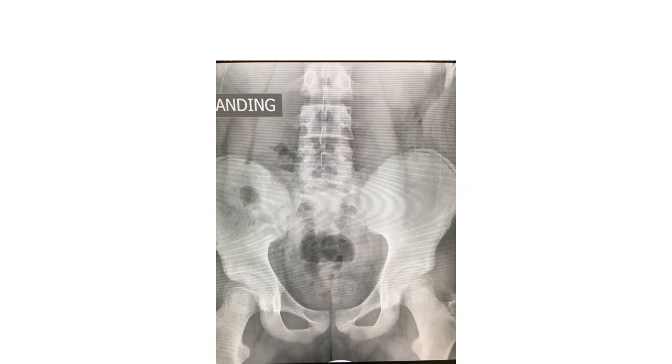Okay? This doesn't affect this patient at all. That's not spina bifida, the neurologic problem. It's just a bony irregularity that maybe 2 to 5% of the population have.